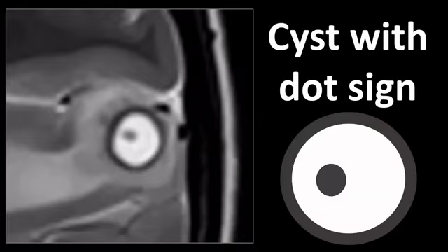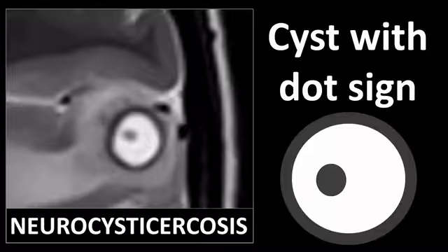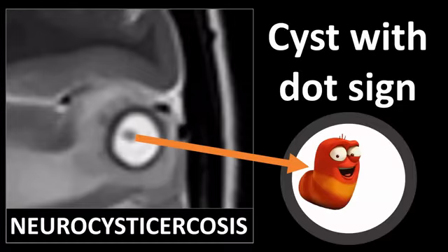This finding is almost pathognomonic, if not pathognomonic, for neurocysticercosis. It is a parasitic disorder in which you have cysts which contain the neurocysticercosis larva.